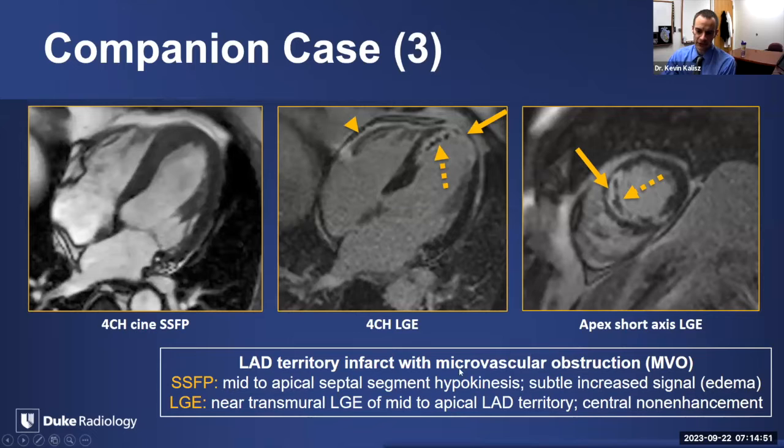So really this still indicates that the patient had a prior myocardial infarction, but this is essentially really damaged myocardium. Just another way of looking at it here, short axis essentially through this level. Similar findings here, you see the LGE, but in the center and the interior of this LGE, it's not even enhancing at this point in the exam.